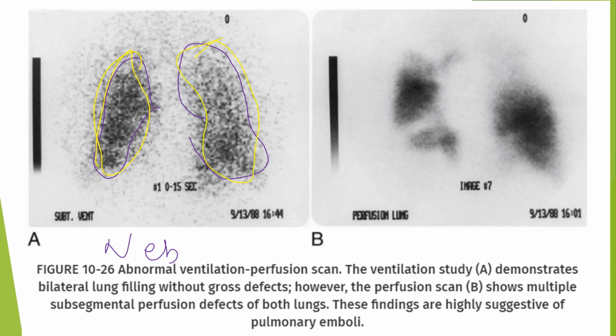So we're comparing the two. Over here is where they gave the patient the injection. Here we should see this whole area radiolucent. We should see it dark, like we see over here. We should see this whole dark area, but we don't see it 100% dark on all the areas. And that's where letter B over here, this is the injection. This is what's looking at perfusion.